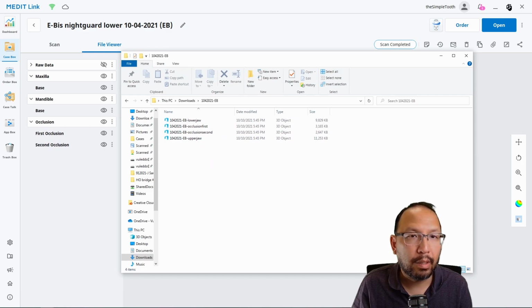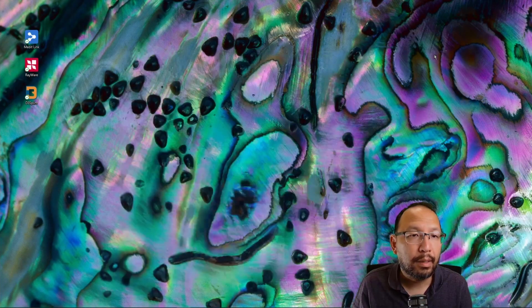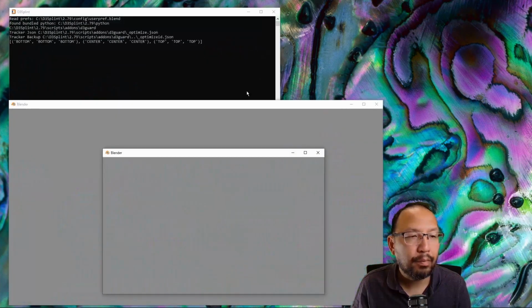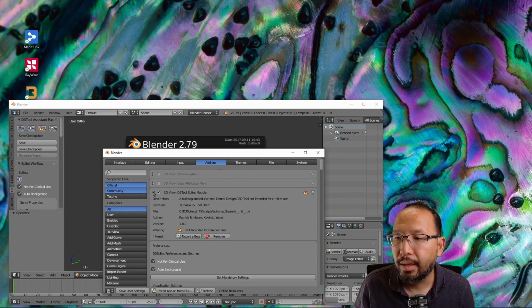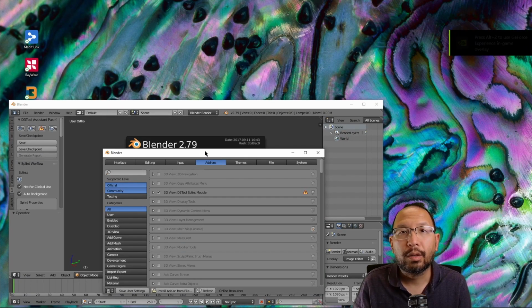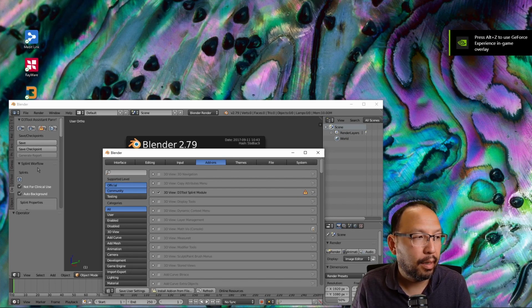The next thing we're going to do is open up D3Splint right here. In a previous video, I talked about the user preferences here and setting those up. Look it up on the YouTube channel. Let's go ahead and proceed with the rest of the workflow.